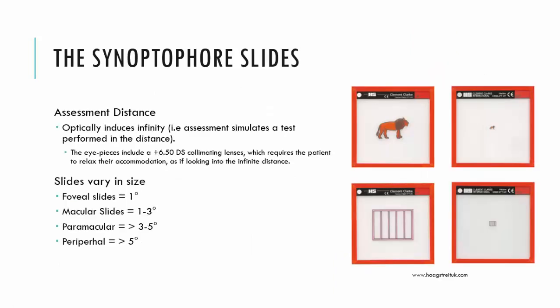Okay, a couple more things about the Synoptophore before we conclude. One is that the Synoptophore is designed to optically simulate infinity or a distance assessment. So when you place a patient on the Synoptophore and you are assessing, for instance, their angle of deviation, it is most closely related to the assessment you performed in the distance.